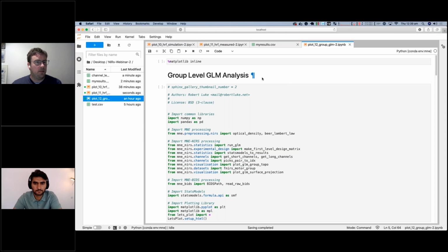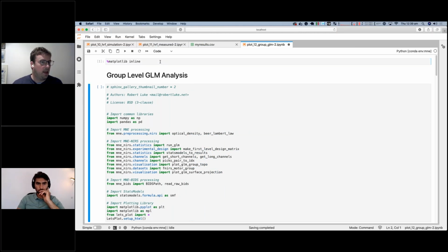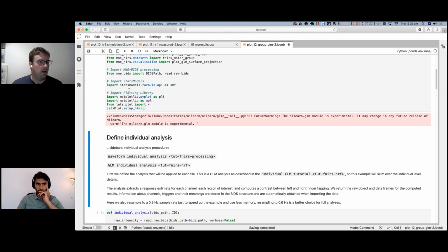Most studies have multiple participants, so we'll dig into how you would analyze your group level data. This is a different tutorial. It's also available on the website. And we start off as always by importing our libraries. So I'll skip over that.